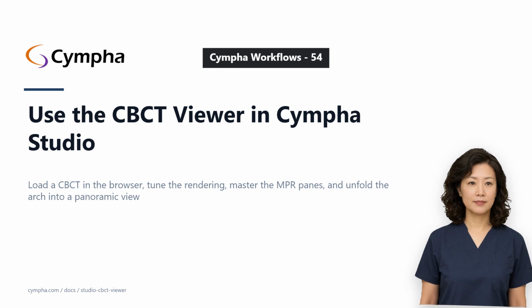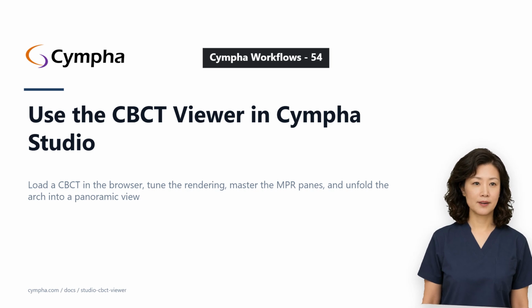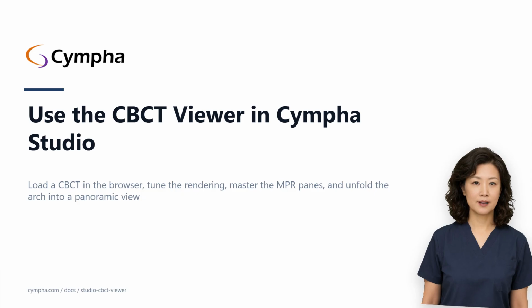Welcome to Guide Mia. Today we're going to talk about the CBCT viewer in Cympha Studio. This one is for clinicians who review CBCT in the browser, orthodontists who want to see roots in 3 dimensions, implant planners checking ridge and sinus anatomy, oral surgeons looking over a case before a consult.